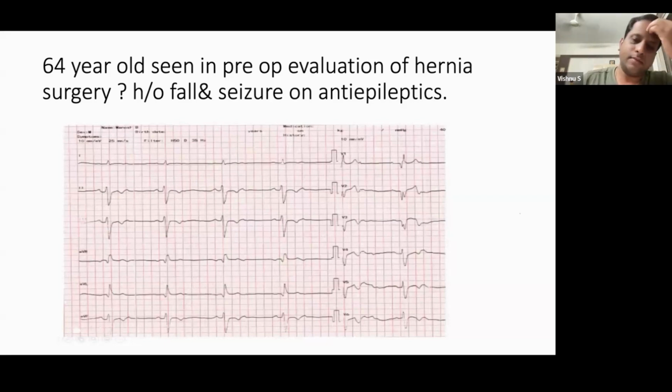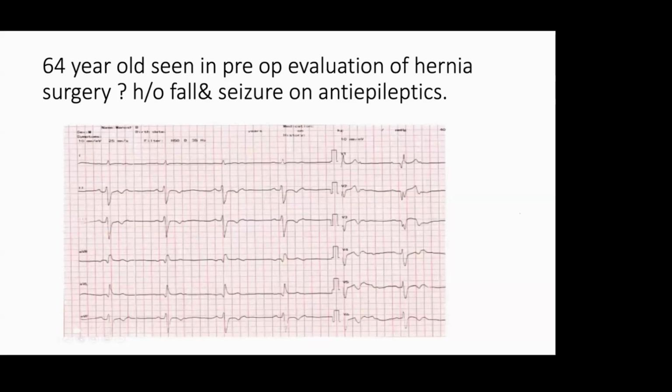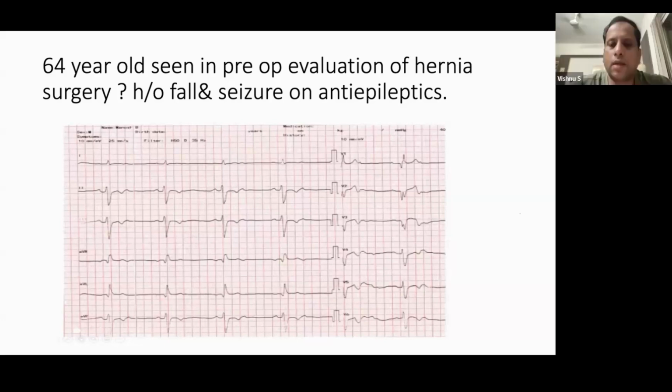Is this a normal sinus rhythm or Type 2 AV block with RBBB? Type 2 AV block, 2:1 AV block. Mobitz type 2, correct, 2:1 AV block. In this, you all see that at the end of this T wave there is a positive deflection. Like this, only the P waves will come in like this. 2:1 AV block with RBBB.